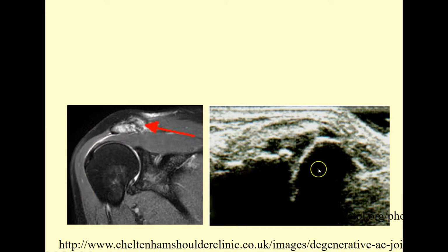Here's a very poor ultrasound image. This reminds me we have better ultrasound images, and I need to just get one out of our holdings since we do such a good job with diagnostic ultrasound here.